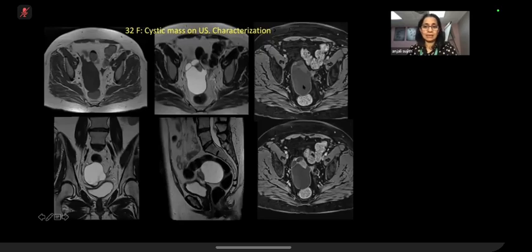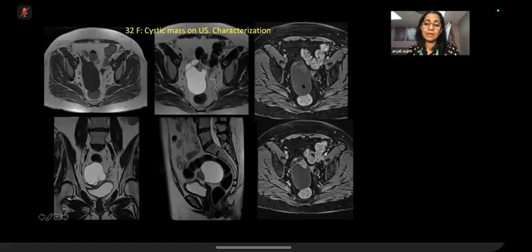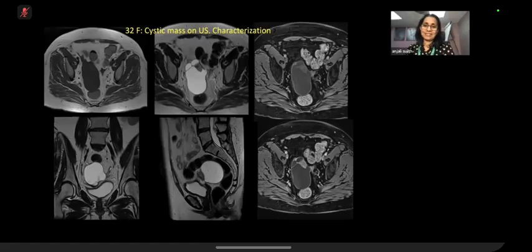Yes. And this is what suppresses on T1. The fluid component suppresses. We compare the T1 with the T1 fat suppressed. So the fluid is low and fluid remains low. Yeah, so there is no fat here. Yeah, I said it's a fat suppressed sequence. Okay. So I thought you meant there is fat suppression. Okay, no, yeah, go on.